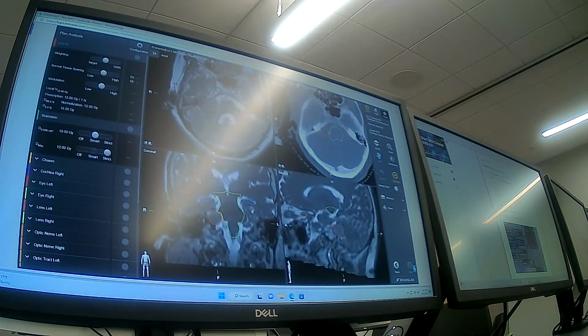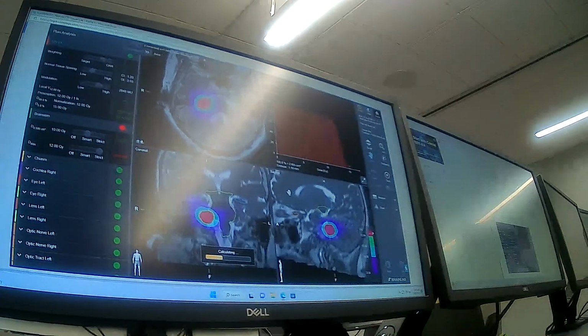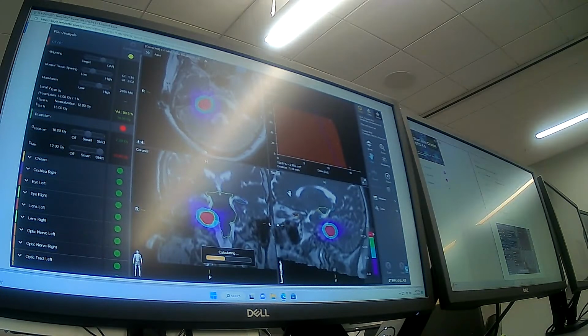Okay, what is this intersection? Okay, I just want to put you in that comfort. So did you make a PTV? Okay, so go to PTV, unhighlight that. Click on all versions.